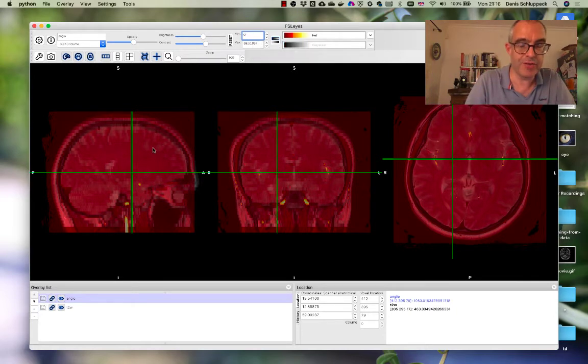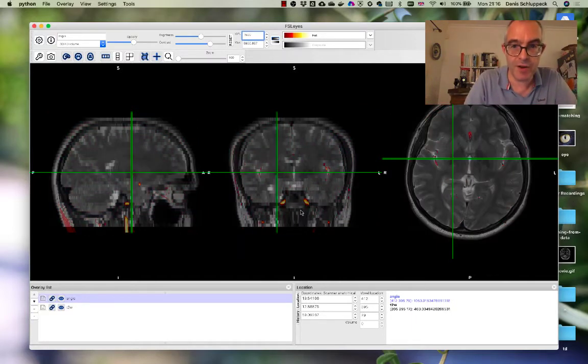So in the red image, rather than showing everything from 0 all the way to the highest intensity, if I only show the high intensity values by cutting everything else below off, so if I set this to 1500, a value I looked at before that seems to work, you can see that the only thing that really remains are these very bright spots.